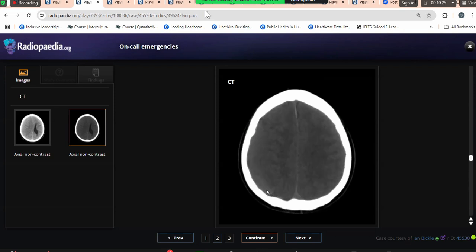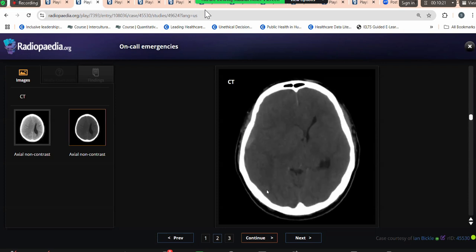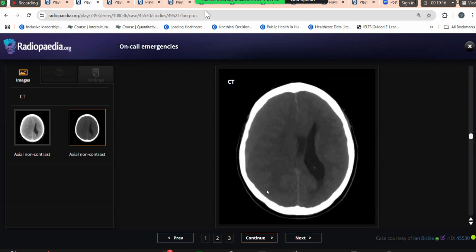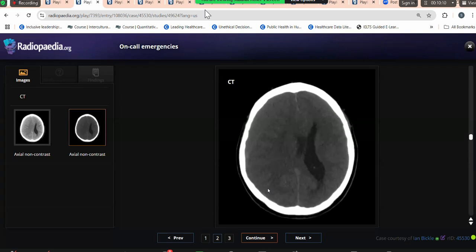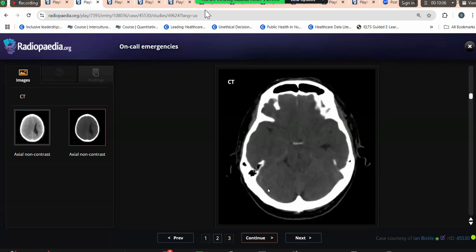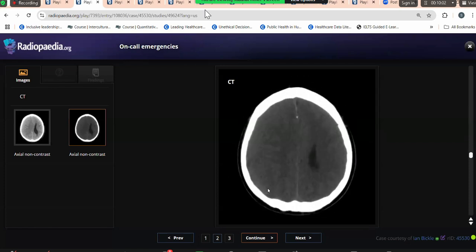a second episode of subdural hemorrhage. The only thing I'll say here, once you have told that there is a subdural hemorrhage, it is causing mass effect, midline shift, subfalcine herniation with the pressure effect on the right lateral ventricle. Do not go into further details that I cannot see the frontal horn, I cannot see the occipital horn. You are losing your time. You have picked up all the good findings. You have summarized it. You're good to go.